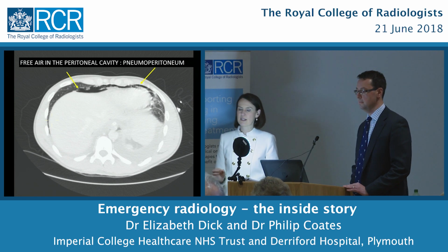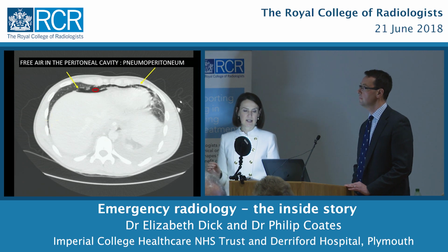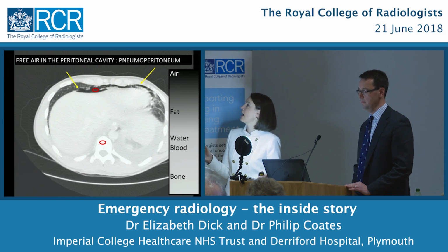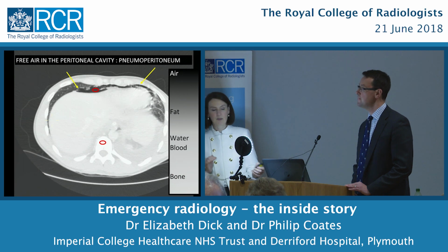So how do we know that there's free air here? Well, the reason we know there's free air is we can measure it, and we can compare that to a grayscale. Air is always black, bone is always white, and then everything else is in between.